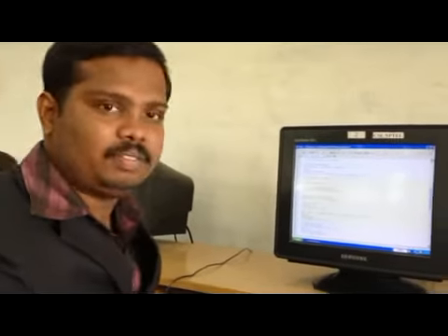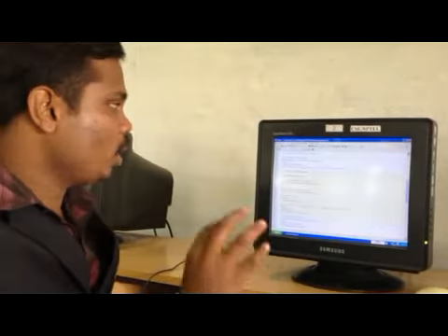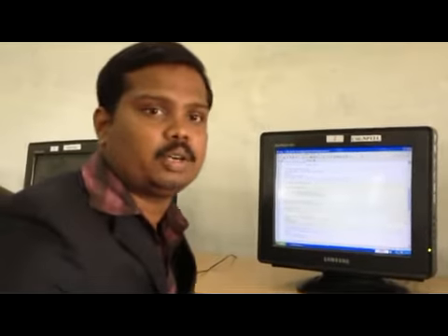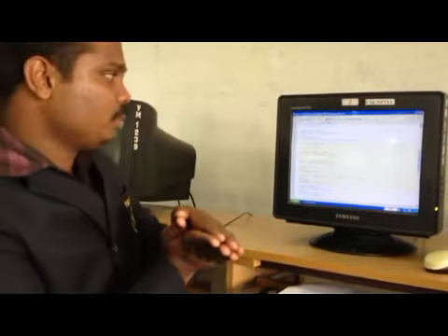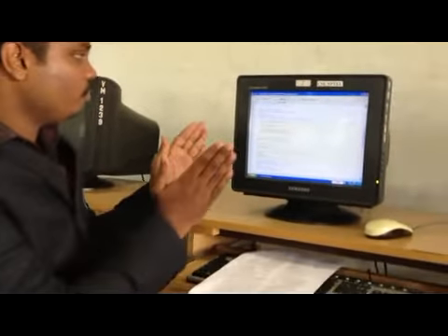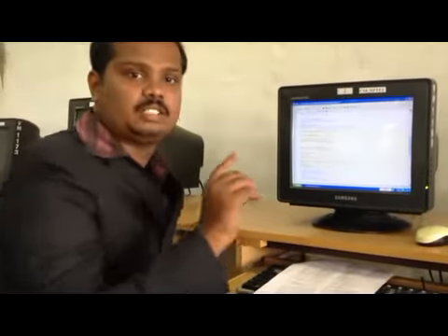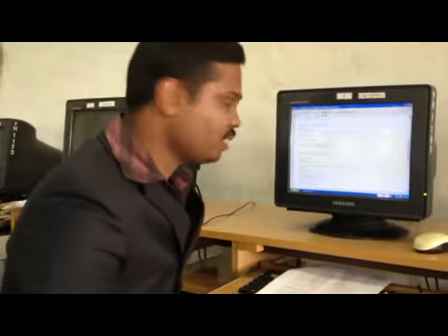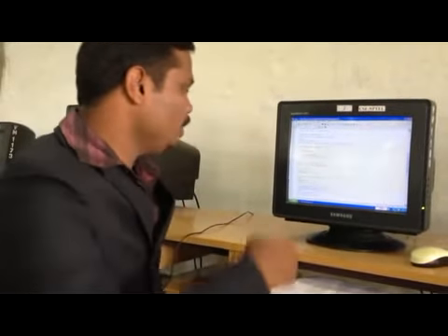Now let me continue with the circular fitting method. As I already told you, the optic disc is the brightest point, and in order to find the brightest point, we are going to take the median of the maximum pixel values. Once we consider the maximum pixel values, we then draw a mask around the circle using a radius of 40, and we take the meshgrid, which is the syntax we used.